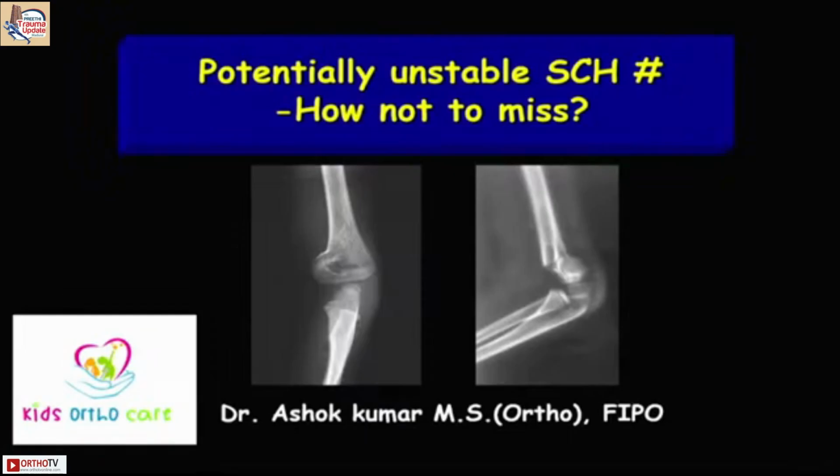Now, supracondylar humerus fracture is one of the most common fractures we see in our day-to-day practice. Now, a quick show of hands. These are X-rays of two different patients. How many of you will operate on these cases? Yeah, very few. Most of you think they are very innocuous and they can heal conservatively.